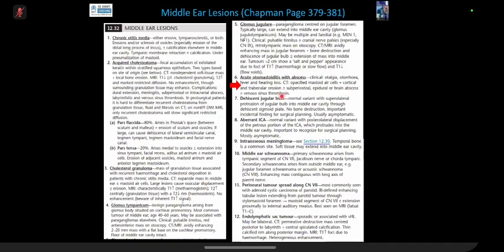The candidate did well, looking for any dehiscence, and at places some suspicion was raised, and there were minor erosions and cortical dehiscence. And there was a brain abscess. Again, the candidate did well, being worried about other things happening and asked for the next exam, which I'll show you.